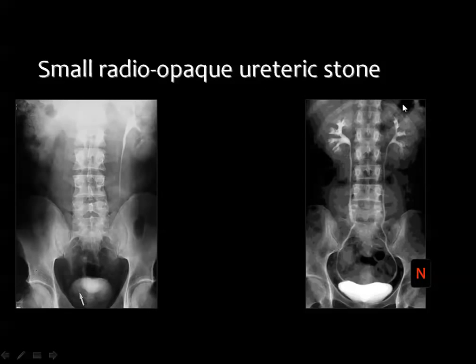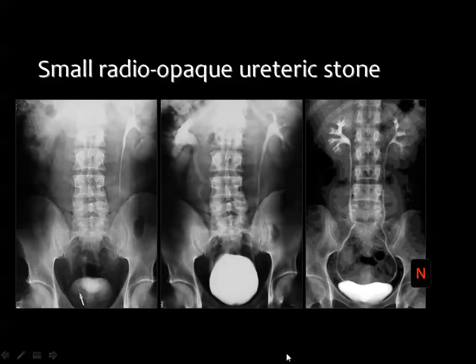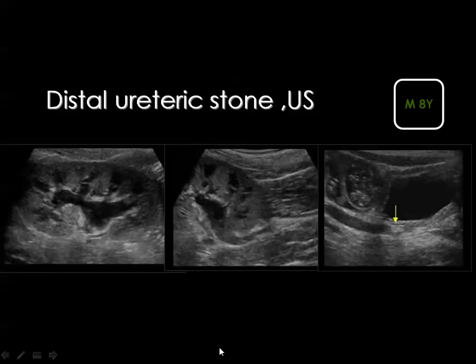Then look at this patient, and this is a normal urography, kidneys, ureters, and urinary bladder. In this particular case, you can see the left kidney is functioning well, and this is the collecting system, and this is the ureter. But on the right side, there is some delay in the function, and the shadow of the kidney is here, but this arrow points to a suspected radiopaque calculus in the distal part of the ureter. The delayed film confirmed this possibility. Here you can see that the pelvicalyceal system is distended and the ureter is dilated along its whole course, secondary to obstruction of the ureter by this very small calculus.